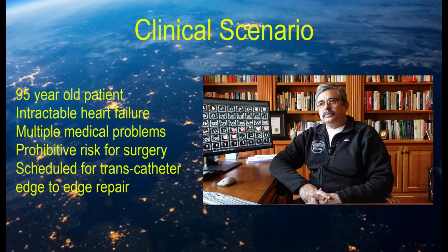So we'll go over the specific methods, the tips and tricks of optimizing these imagings and getting significantly higher frame rates and significantly higher line density to make this diagnosis and to bail you out of this challenging situation. So let's go over this tutorial.